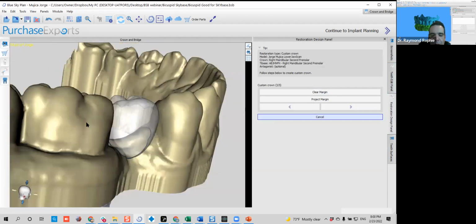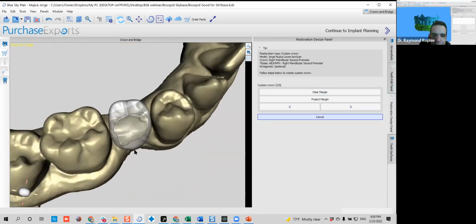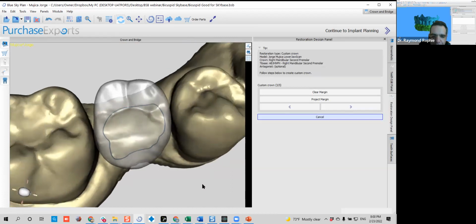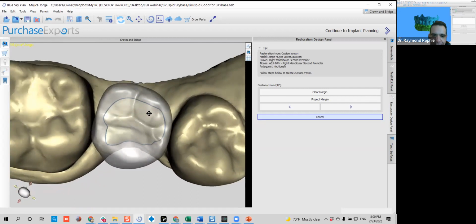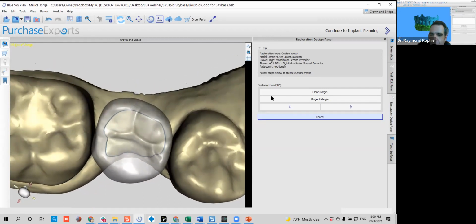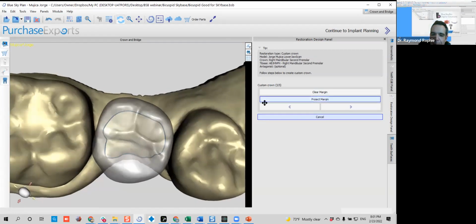Nice. So now what we do in this step. Sorry about that, I didn't want it to have any hiccup here, but this is life. Okay, good. So now we will select the custom crown margin and the emergence profile. This is the area where I can definitely send you, if you request them, a few articles about the emergence profile, by Dr. Salama, Dr. Ernesto Lee, Dr. Shu.